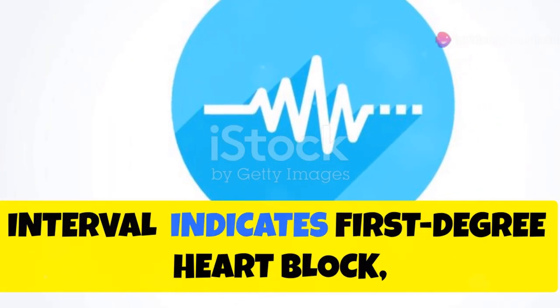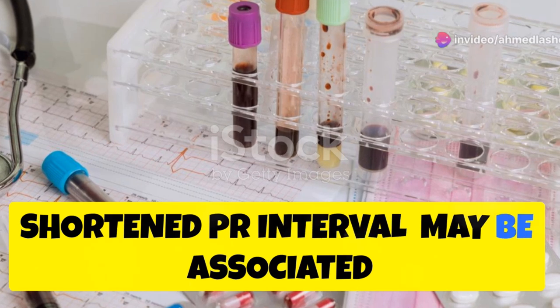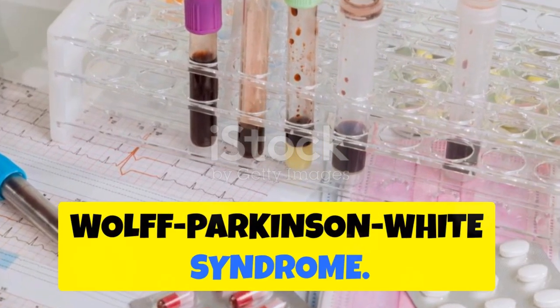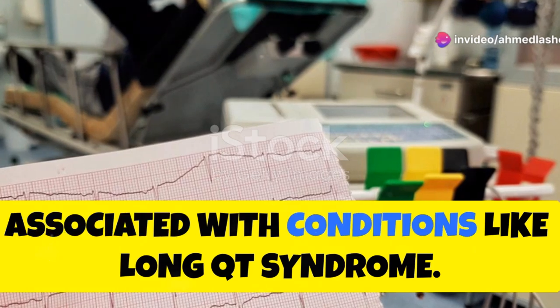Prolonged PR interval indicates first-degree heart block, where the impulse is delayed but still reaches the ventricles. Shortened PR interval may be associated with pre-excitation syndromes like Wolff-Parkinson-White syndrome. QT interval prolongation can increase the risk of ventricular arrhythmias and is associated with conditions like long QT syndrome.